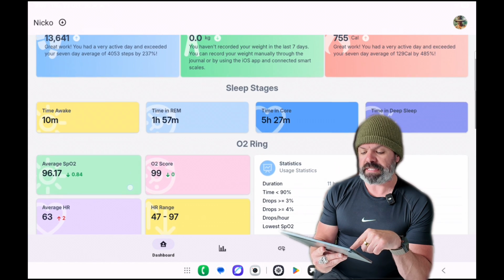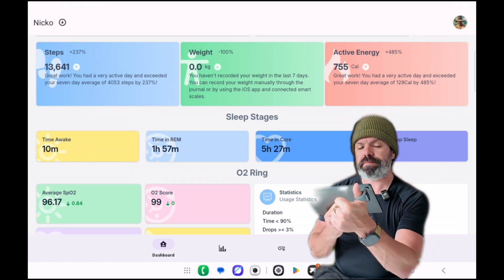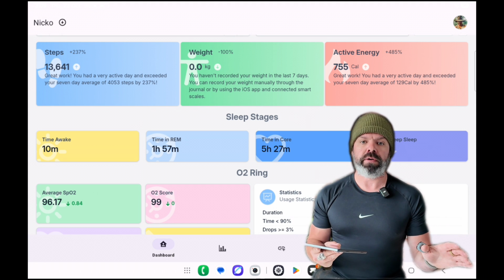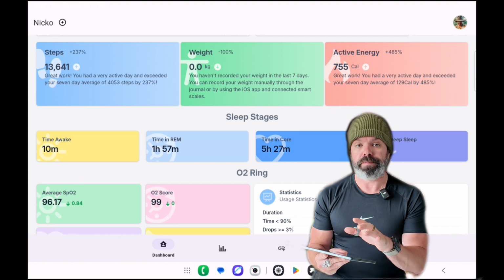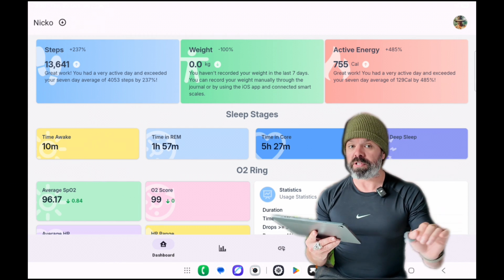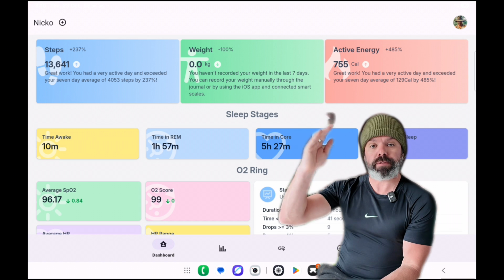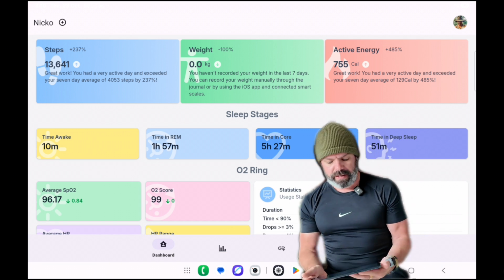You need to have data from either a CPAP or an O2 ring. What I mean by that is you can't just jump into bed with your Fitbit on and then look at your sleep stage information in SleepHQ. It needs to be synced with one of those two devices. We will most likely change that though in the future. So you just have this great, nice big sleep health dashboard, even if you don't have a CPAP machine or an O2 ring.